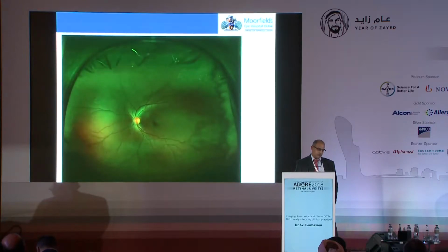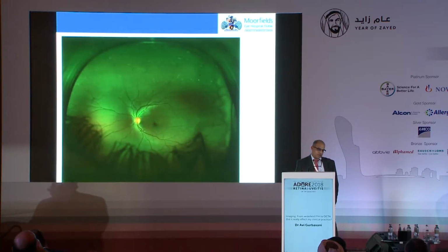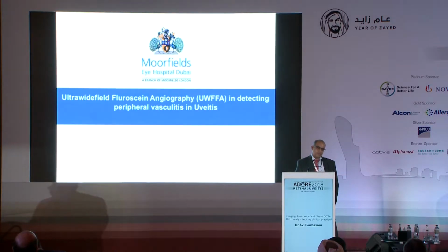Monitoring patients also, again, this can be used in any patients. So this normal looking fundus, a lady with chicken pox, presented with this whitening in the far periphery, and it's very easy to monitor the patient week by week, and you can see that the progression was halted with treatment.